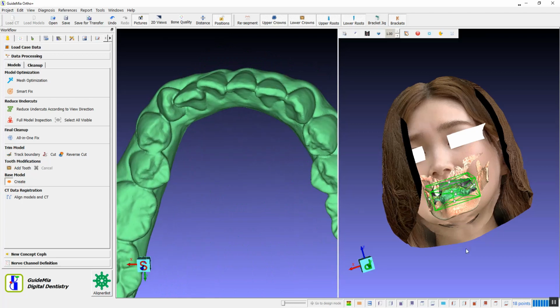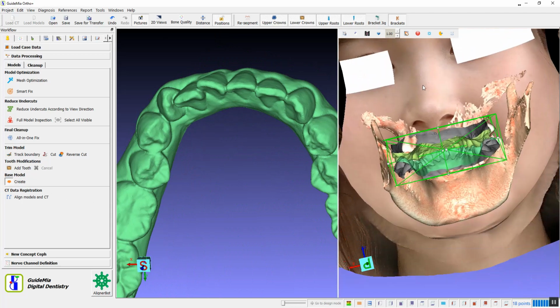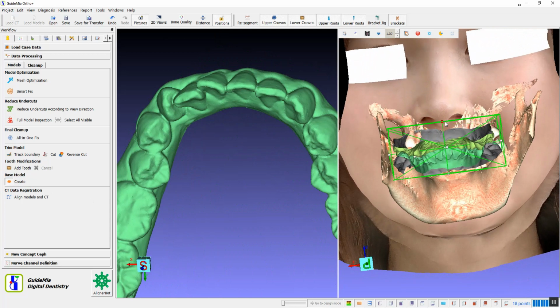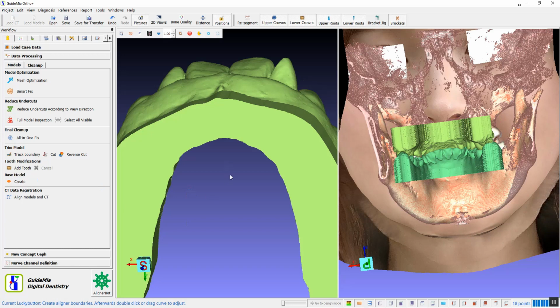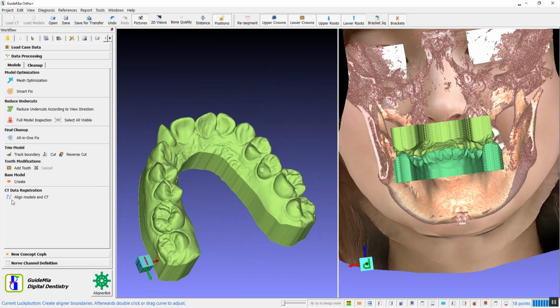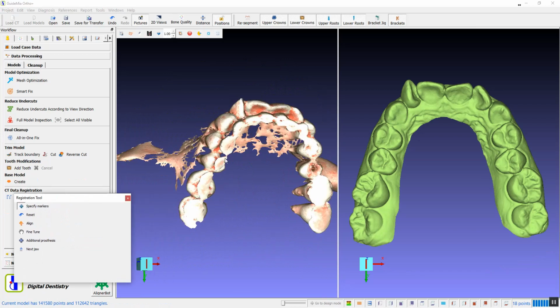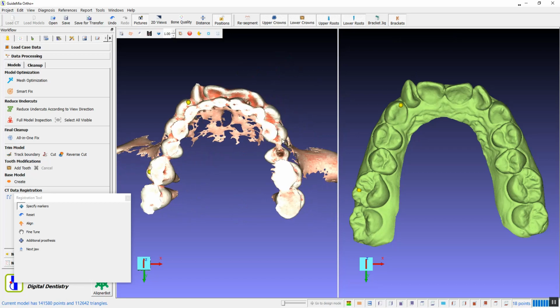After such preparation, we can then close the shells and make solid models. The handles are dragged to resize the models. Next we register the models with a patient CT scan. Similar process as facial registration. 3 pair of points are selected.